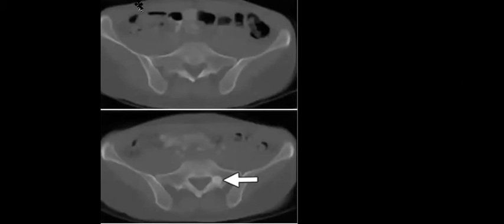So now you have this image and you get this image. In this image, probably I see two doctors. One of them reports one here and one of them reports here. And in this image, what do you write in your report? Yes? So what do you write in your report?